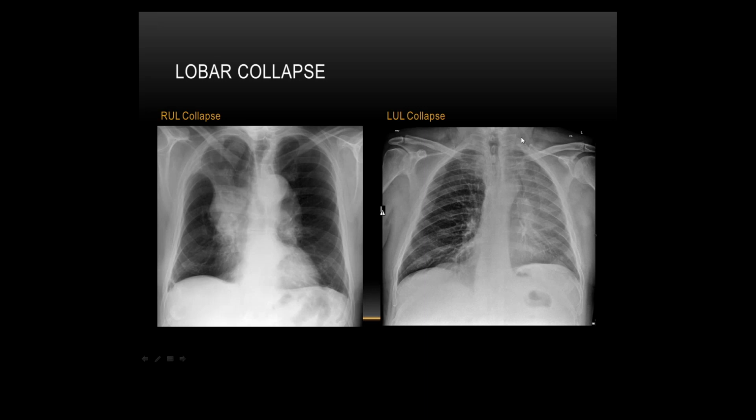What happens is the left upper lobe collapses forward and then up a little bit, so that becomes denser. But you've still got aerated lung behind the upper lobe. Does that make sense? So you get that veil appearance because you get the increased opacification of the upper lobe overlying the aerated lower lobe. So that's why you get that appearance.